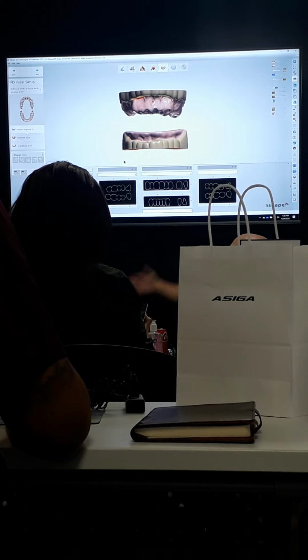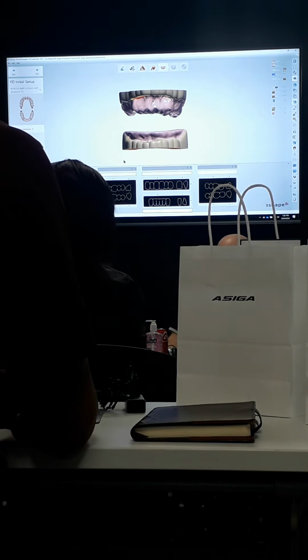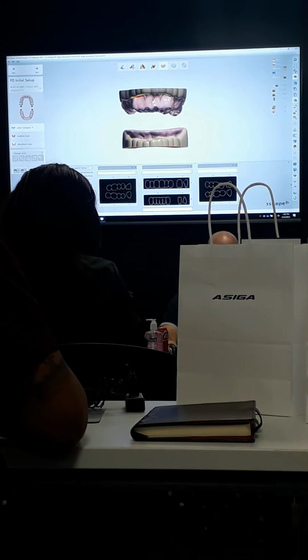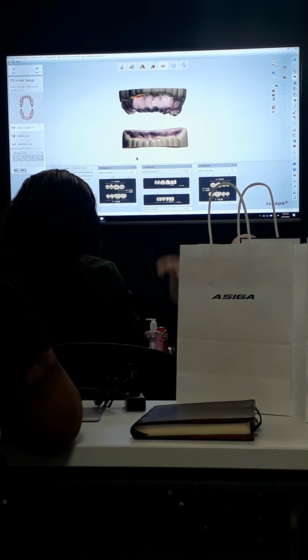And as soon as I do that, you see how everything's black here across the bottom? The reason for this is because of the way that the libraries are set up. When I come over here to the left, underneath my provider box, I'll see this Show Full Arch Libraries Only option here. I need to make sure that that is selected. So now all of my cards show up.